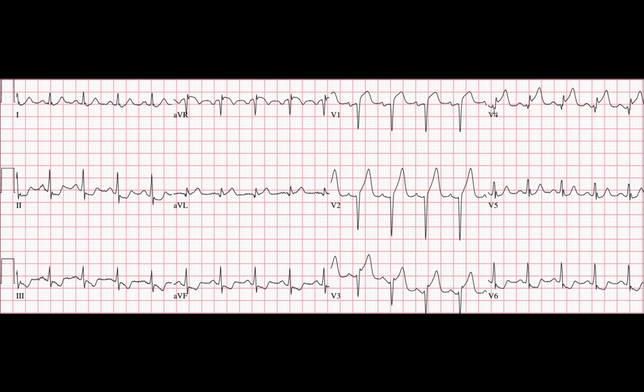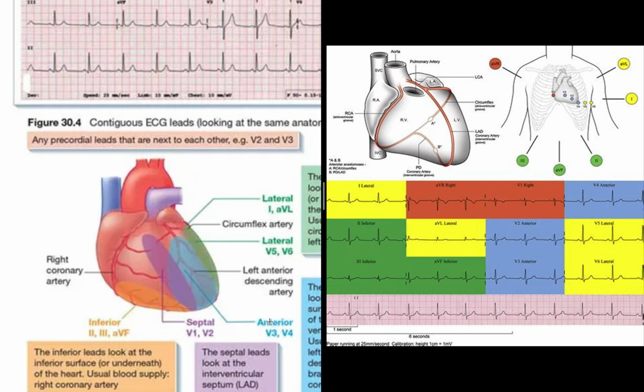So if we keep going, we look at V4. This is clear-cut STEMI. This is a clear-cut ST elevation. Look at that. This is supposed to be the QRS here, and then boom. That's the R. And then look, that's probably over 2 mils. And boom, it has huge takeoff there. We call this a hyperacute T wave. It goes after the R, and it just takes off, and it actually goes even higher than the R. Usually when you're looking at STEMI, specifically if it's more anterior lateral, V4 is going to be the best bet to look at as far as seeing that ST elevation. That's huge there. V4 would be our anterior, so yeah, this is right in our LAD. So it looks like the main problem we're having is with our LAD.